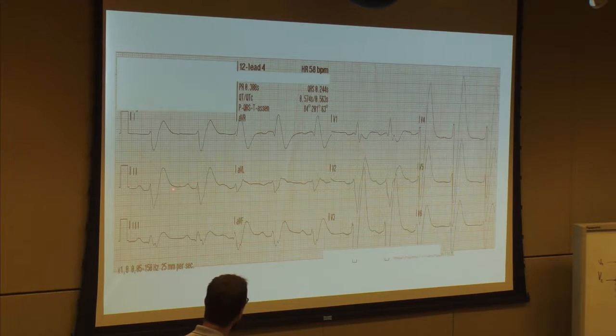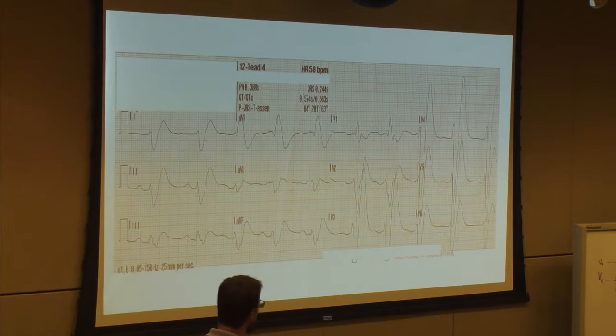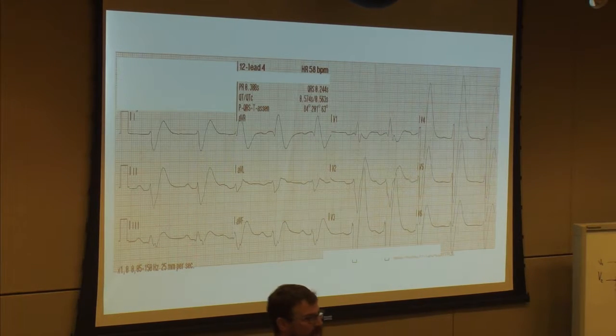By the time I'm this far into hyperkalemia, where does my P wave go? It's gone. That's why people want to call it idioventricular. But I have a nice P wave on all these, a good prominent P wave. So that doesn't go towards hyperkalemia.